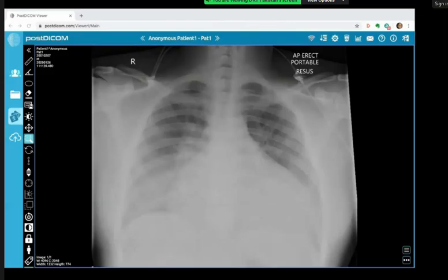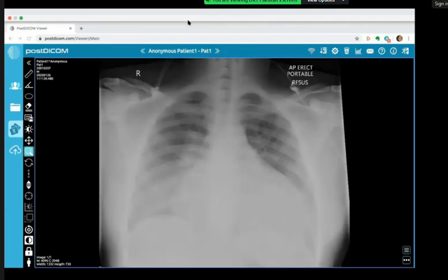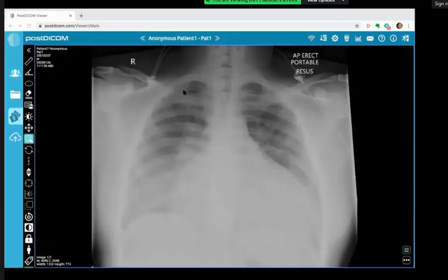So this is a frontal chest X-ray in an adult patient demonstrating large cardiomegaly with generalized enlargement of the heart. There is airspace opacification involving the right hemithorax, predominantly in the lower and the mid zones. The costophrenic angles, I can just make out on both sides.